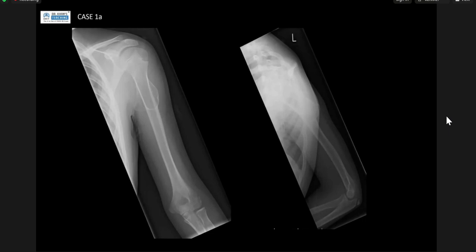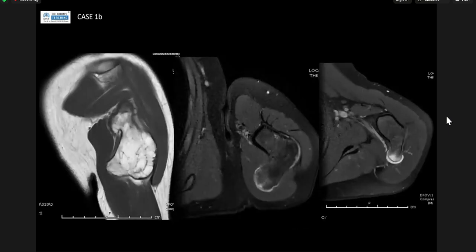Okay, great. If I show you the MR here, you correctly identified this as an osteochondroma, and you can see the medullary continuity within the lesion. You talked a little bit about the cartilage cap, and you're right: you're looking for anything over about 1.5 centimeters in adults. It varies in children, and you'd be guided a little bit clinically. Is there anything that you wanted to mention on the MR?